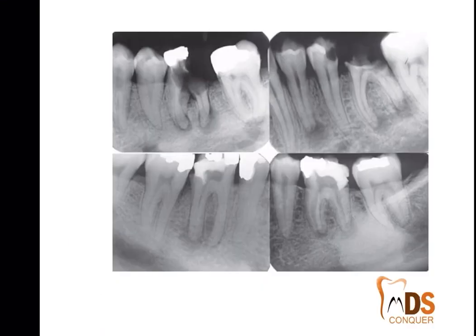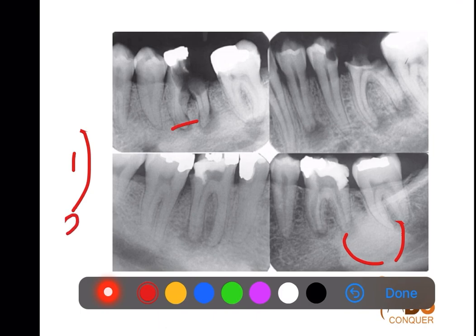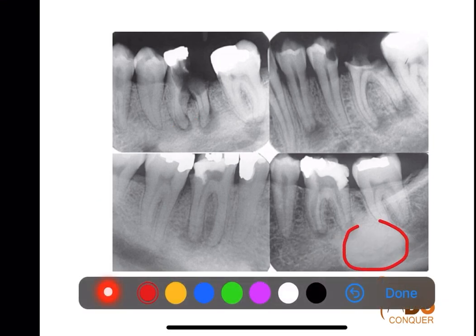Now next, coming to the other abnormality. If you see the radiograph that is given to you, almost at the molars there is a radiolucency which is surrounded by a haphazard radiopacity, right? So first, localization: yes, the molars and the premolars are involved. Second, the periphery is ill defined, it is not that well defined. Third, the internal structure is more of a mixed type, right? And again, the effect on the surrounding structures.